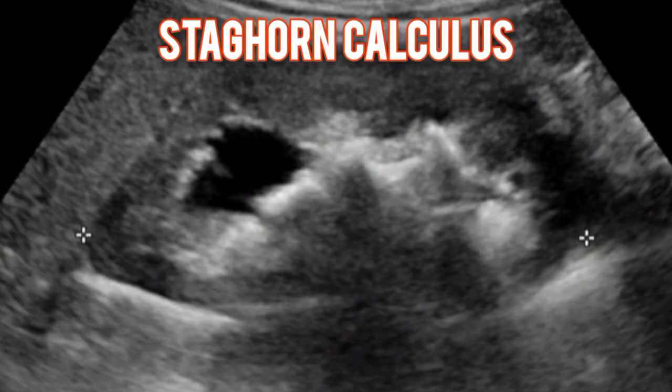A staghorn calculus is a stone that completely fills the entire collecting system. That's to say, the pelvis and the calyces. It is usually associated with chronic infection and obstruction. Sonographically, staghorn calculus appears as a curved echogenic structure in the renal sinus area with posterior acoustic shadowing, which often hides any associated hydronephrosis.